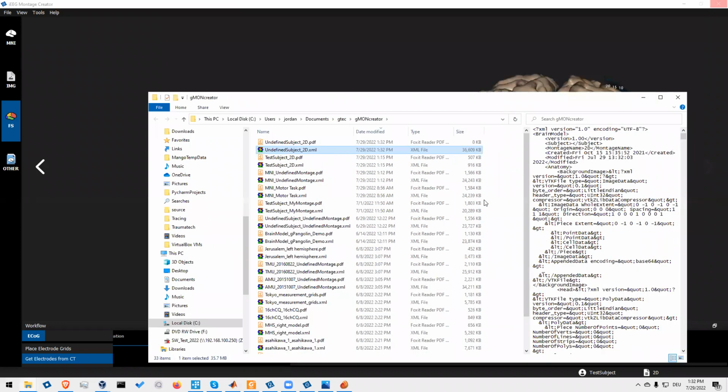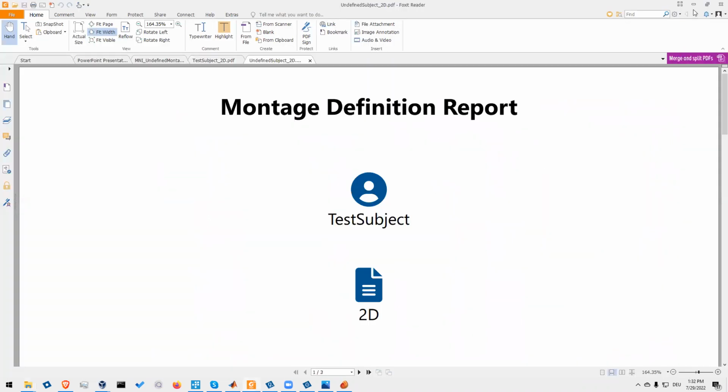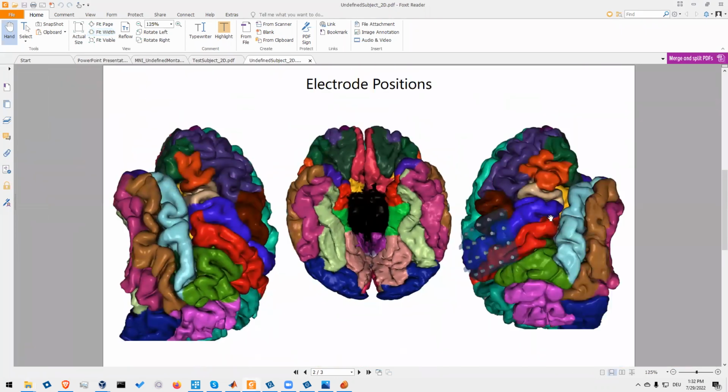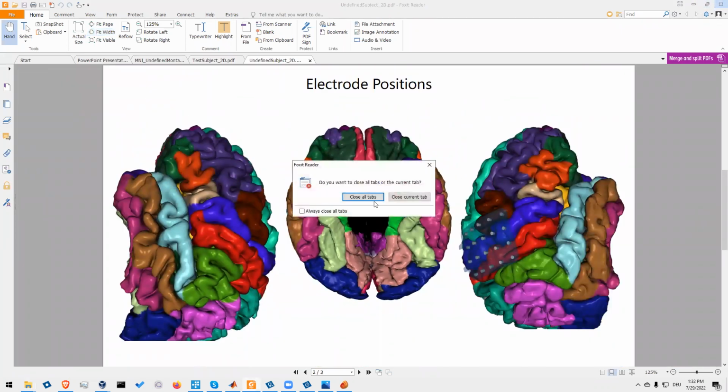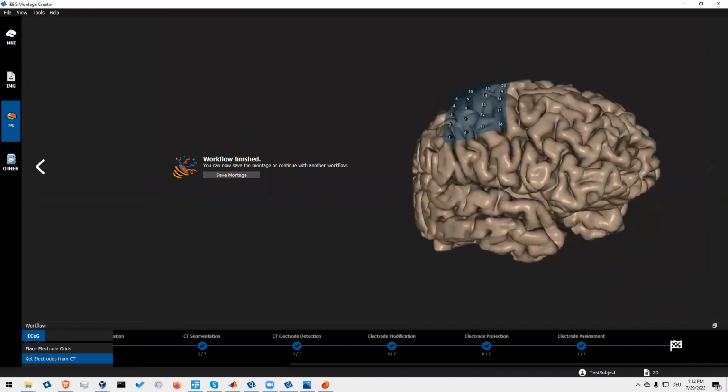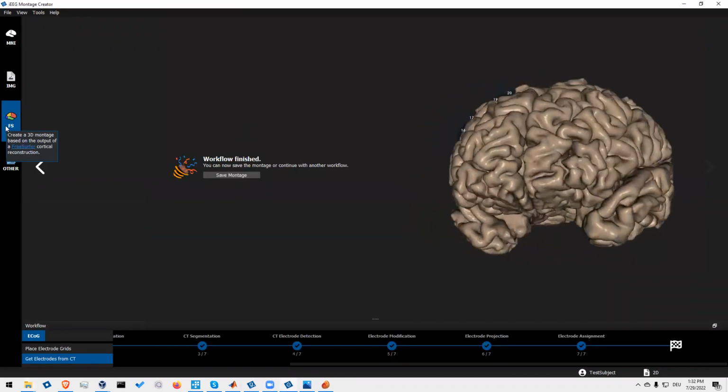Yeah, so now I didn't change the montage name, but it's now a 3D montage. So that's the third option, what you can do.